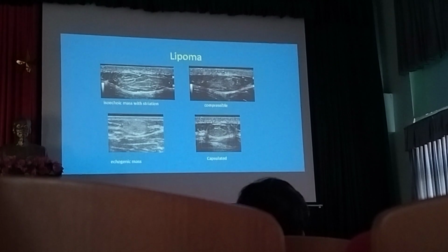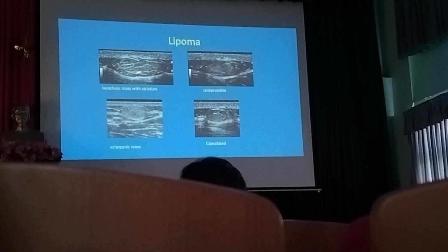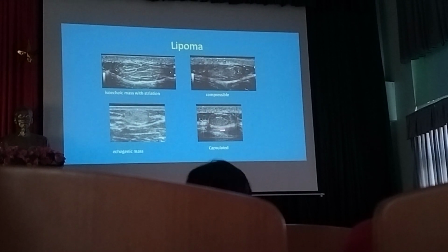Okay, and this is the example of lipoma that you can have, an isoechoic mass with a striation pattern inside. It is compressible, and sometimes it can be an echogenic mass, well circumscribed, and this can be well encapsulated.